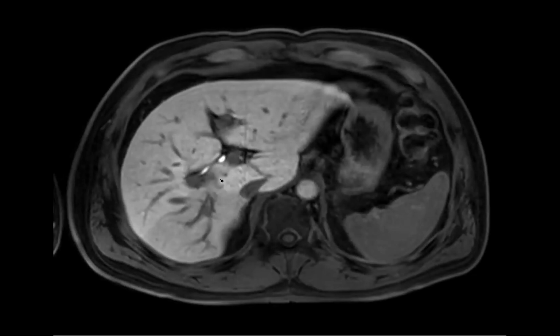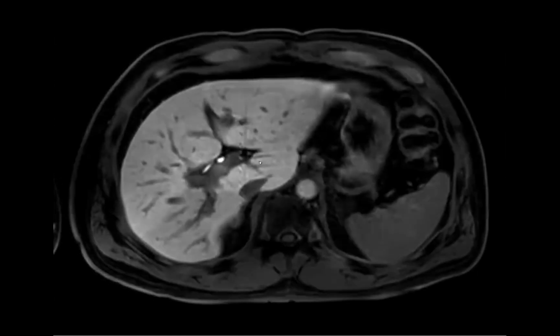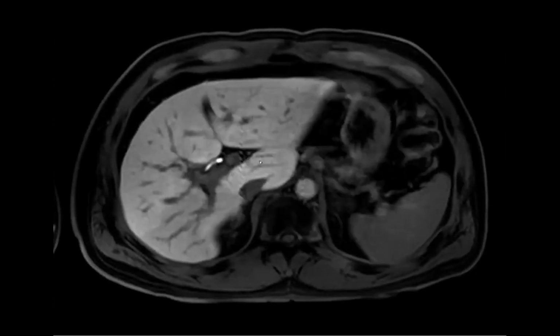Yeah, I've seen cases like this, and people ask me, well, what's the treatment? And basically they don't treat it. They don't try to open it up. They just let the posterior sector atrophy. Yeah. And it would be like the argument for doing an MRCP on everybody before they get a cholecystectomy, but that's not practical.